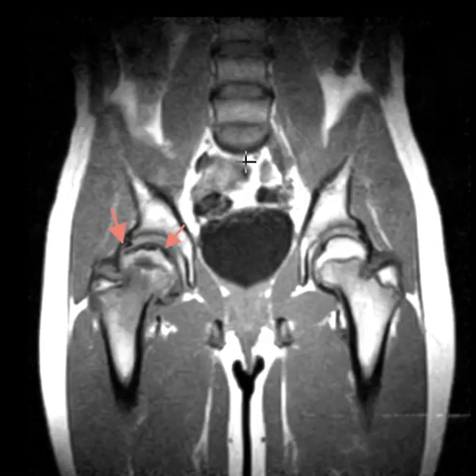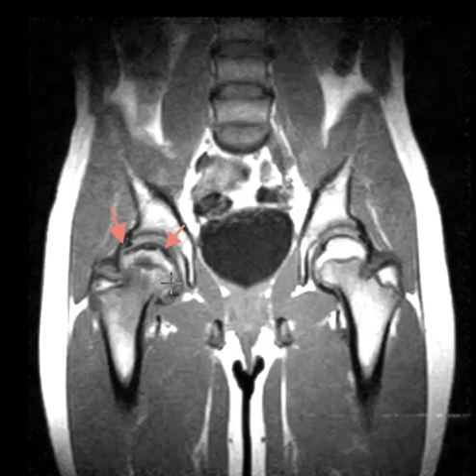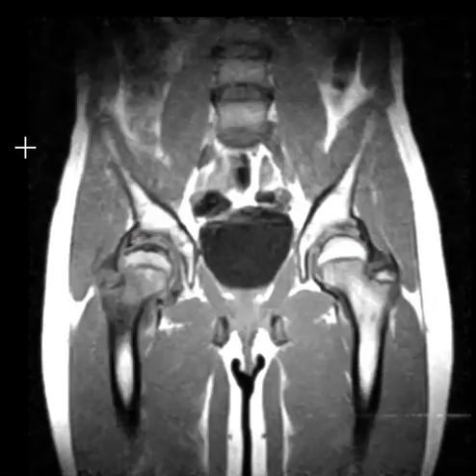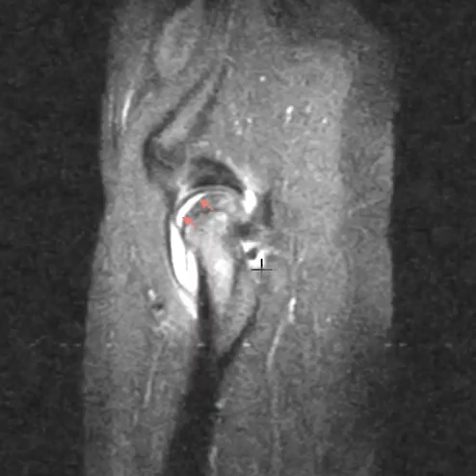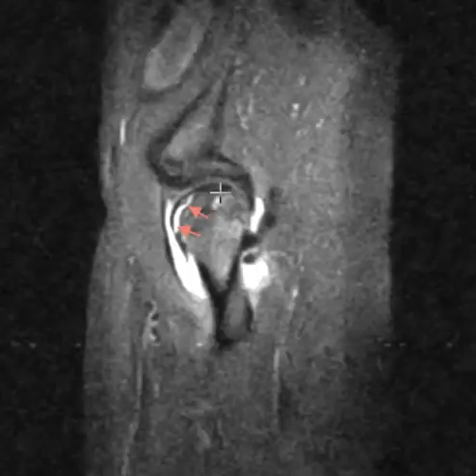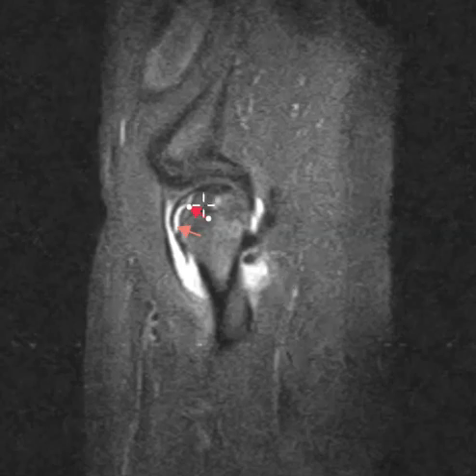And so that's it, an unusual case of, it looks like AVN of the right hip in this gymnast, and also the subperiosteal fluid collection here, uplifting the articular cortex or periosteum here, and an associated prominent or moderate sized joint effusion.